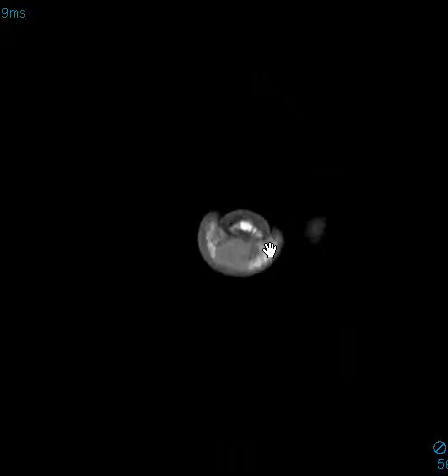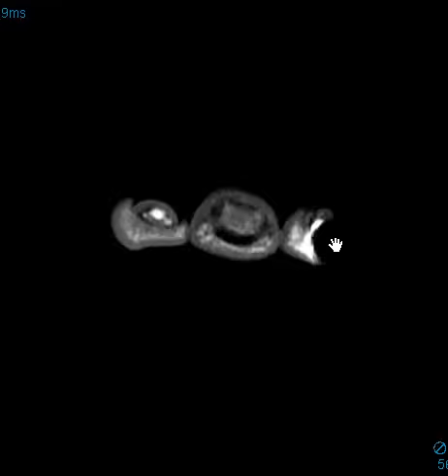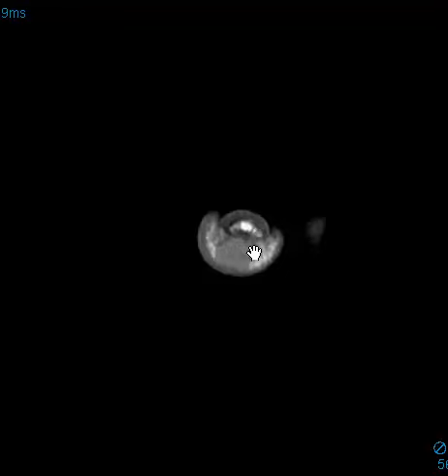So there are two main things this could be. Number one, this could be an epidermal inclusion cyst. I think that's what it is, just because it's so uniform, and they have the susceptibility artifact from the adjacent digit here. So they've had an injury before, so it may be an epidermal inclusion cyst, where dermal elements get introduced into the soft tissues and it grows into a cyst.